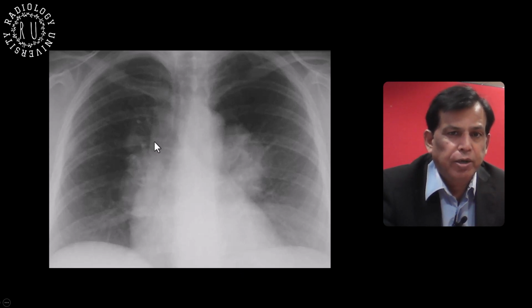This was a paraspinal stripe widening, which is also typical of lymphadenopathy. So that's not vascular. It is all lymphatic and nodular thinking.